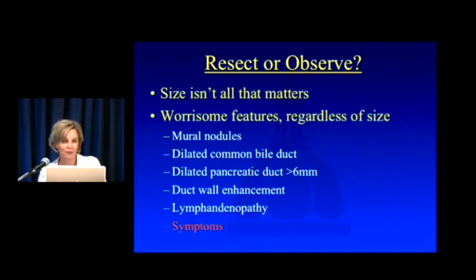Do you have ductal dilatation? Especially when the pancreatic duct gets very large, then you're starting to think of a main duct IPMN, and those definitely have a higher chance of having a malignancy.